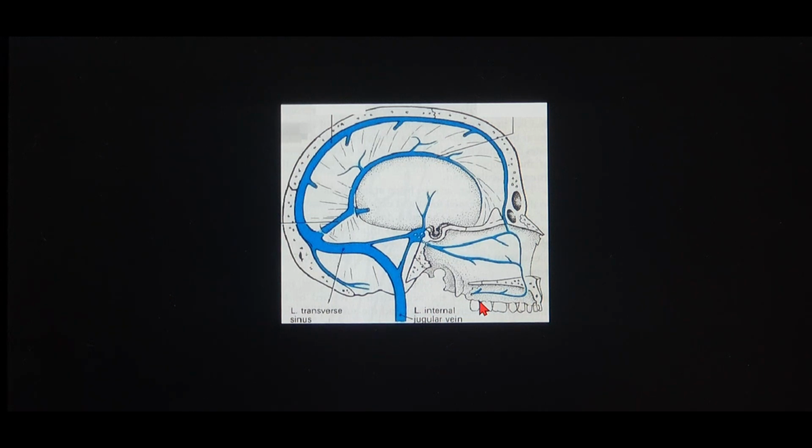So the same thing, it's okay, you know the anatomy, but what if in the examinations you are given the MR venography as a spotter for your practical exam, for all the postgraduate students, be it in ENT or neurosurgery.